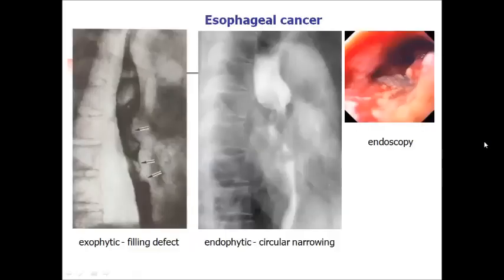Esophageal cancer, a challenging problem in oncology, but we should not discuss epidemiology, clinic. We will concentrate only on radiographic features.